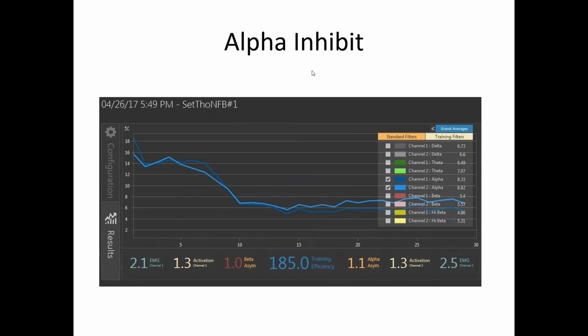And the trend screens are the heart of what we're doing because, one, human beings are very good at pattern recognition, and they can see patterns in time series analysis, I believe, based on the research I've read in neuropsychology, better than you can just looking at numbers. And so you will see patterns in your trend screen that are reflecting the normalization patterns in the numbers.